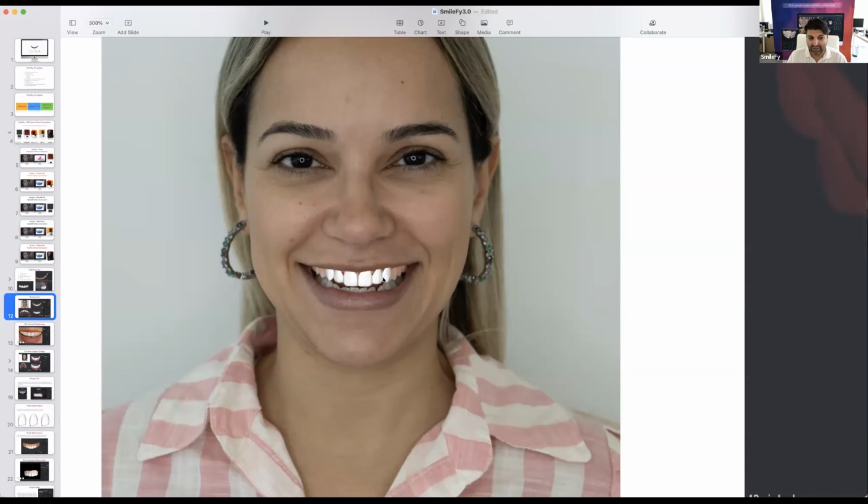There was a challenge because I wanted to keep the best quality of the buccal surface of the tooth, the quality and the resolution, but adjust the gingival margins in a different way. What I'm going to show you is very easy to use, and it is so much fun that I worked to improve every single step of this workflow.